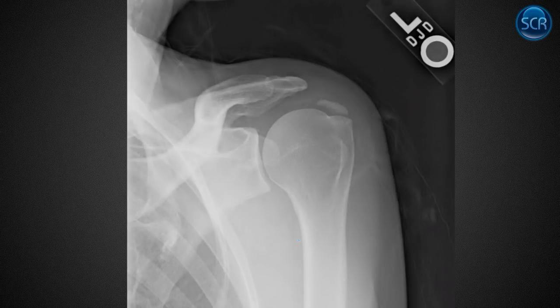All right, so what are we seeing in this one? Everything looks perfectly normal aside from this thing. They've got some calcific tendinosis here. Hydroxyapatite deposition within the supraspinatus tendon. That's the most common site. So if you see any little bit of chalk floating up there, that's probably supraspinatus calcific tendinosis. It can occur in any of the rotator cuff tendons or the pec, like in that other case we saw. Sometimes you have to look through the humeral head to see it over here, in the infraspinatus coming around. Sometimes you'll see it adjacent to the lesser tuberosity in the subscapularis.